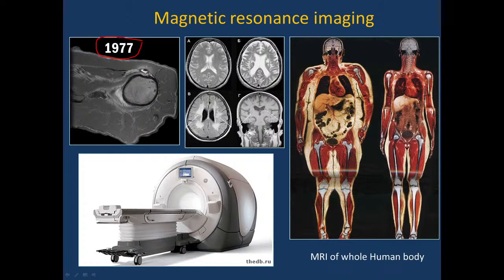And the MRI scanner looks like a CT scan, but with a longer tube. Here it is visible that the tube is longer, not such a short one as the CT scan here, but the MRI scan is twice as long. And this method provides high resolution when using images in different planes. Here it's not only the transverse plane, but also the frontal section, horizontal and sagittal. Here is the frontal section of the whole body. And doctors use MRI scanning to see internal organs and soft tissue because they are visible better than on the CT scan procedure.